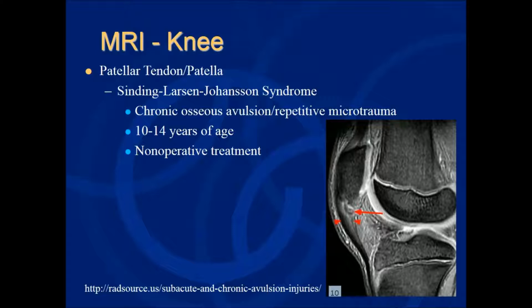It's important to differentiate this from a patellar fracture. Those are usually more proximal or involving the junction of the body and inferior pole of the patella, but it's going to look a lot different. It's going to involve much more of the patella itself rather than just the inferior pole.